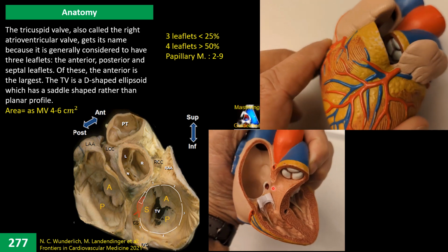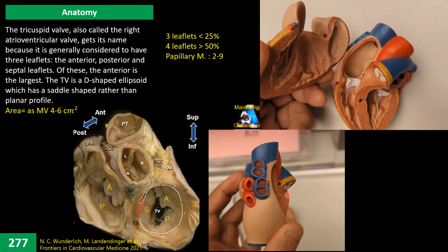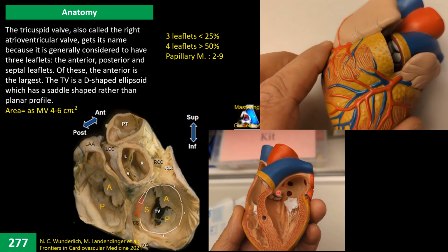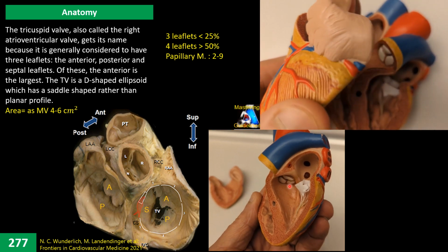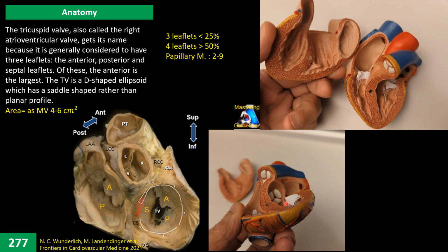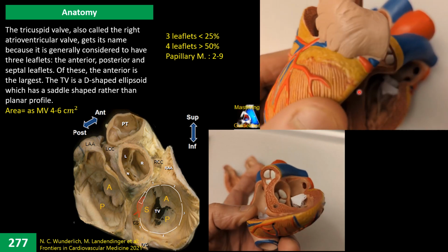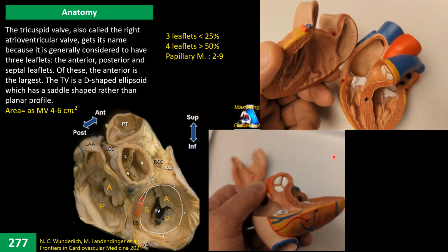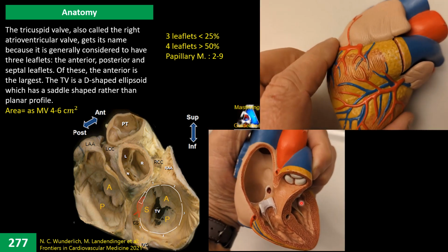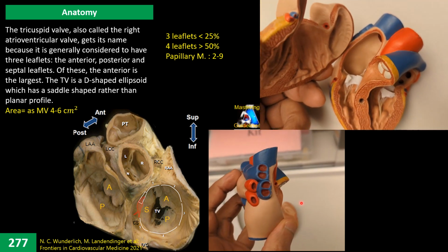Here the coronary sinus drains right superior to the septal leaflet, and you can see the relationship with those other valves and their orientation. Having a good image is very important. I recommend pausing it and getting this one. If you have knowledge, go over it and see how the orientation is of those valves and chambers.